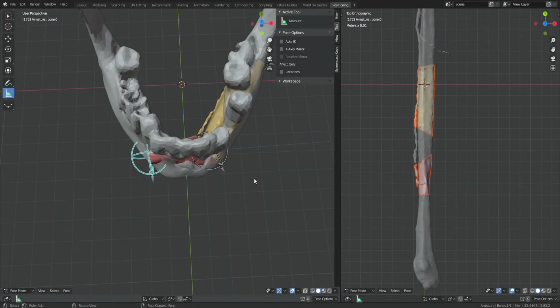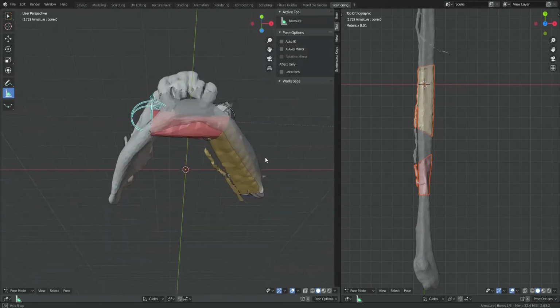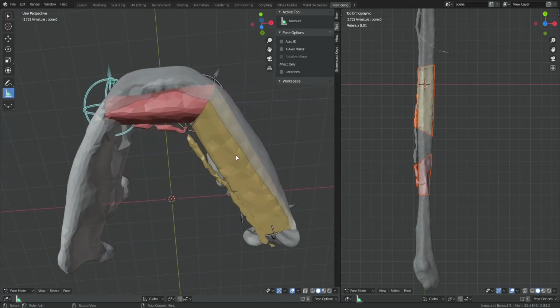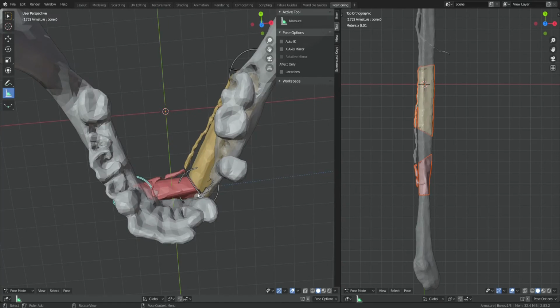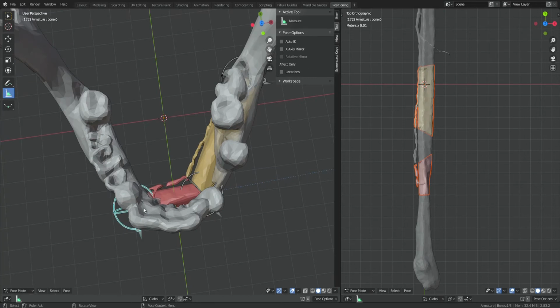I went to visit the surgeons this morning and showed them how the fragments are supposed to look, and I wasn't satisfied. Maybe you could hear me mentioning that yesterday, but this part here where the two segments meet didn't follow the curvature of the mandible.